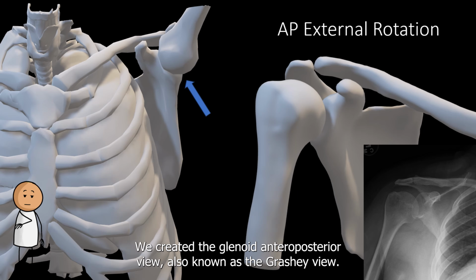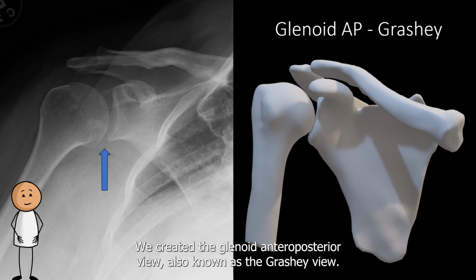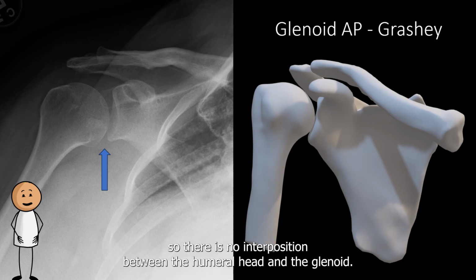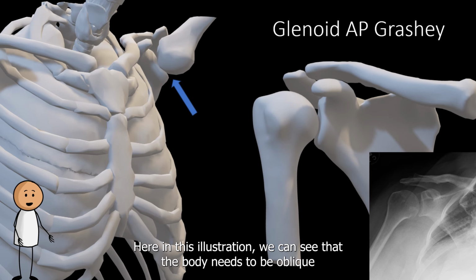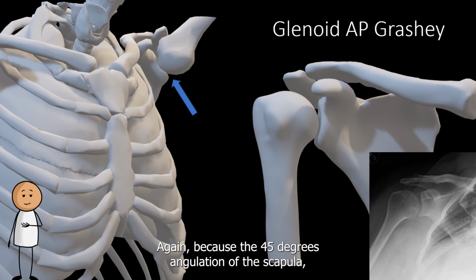To solve this problem, we created the glenoid anteroposterior view, also known as the Grashey view. In this view, we shoot the X-ray beam obliquely to the body so there is no interposition between the humeral head and the glenoid. This way, we can better evaluate the glenohumeral articulation as well as the glenoid and humeral head surface. Here in this illustration, we can see that the body needs to be oblique for us to see the glenohumeral joint without bone interposition, again because of the 45 degrees angulation of the scapula.